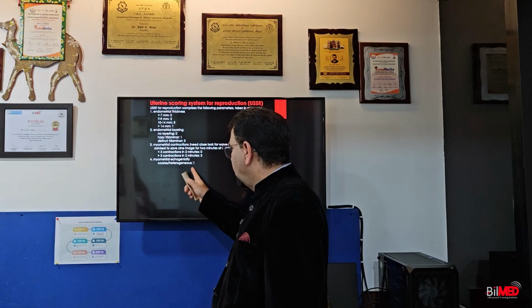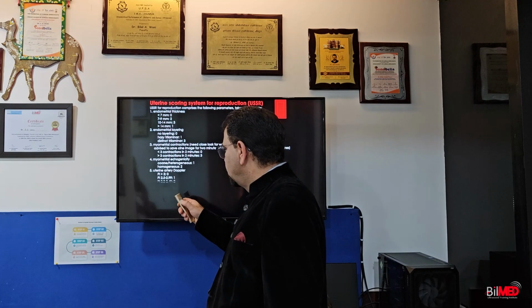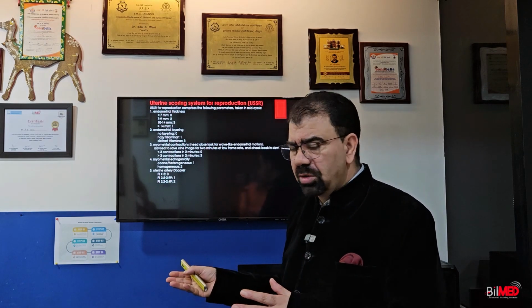Myometrial echogenicity, the 4th point. If coarse or heterogeneous, only 1 point. And if homogeneous, then the score is 2. Uterine artery Doppler. In this uterine artery Doppler, you can make out that the PI, if decreasing, is increasing the score.